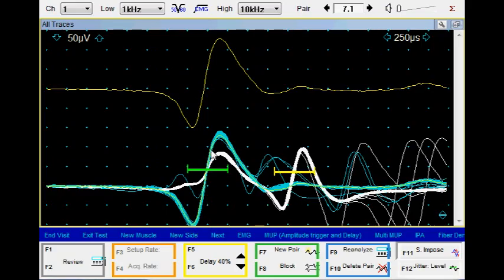When you look at the blue potential, that does not cross the second window. So technically, some people may call it blocking, but this is not real blocking. This is what we call technical blocking. This is activity from another motor unit where we did not record an action potential pair. Obviously, we don't want to include the activity from this larger spike in analysis.